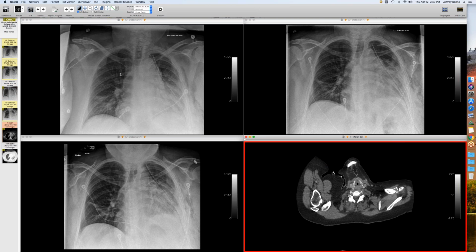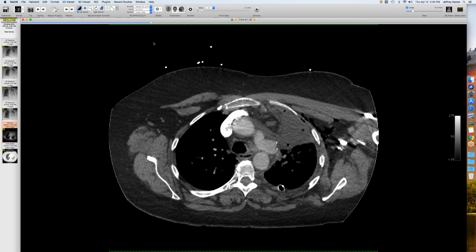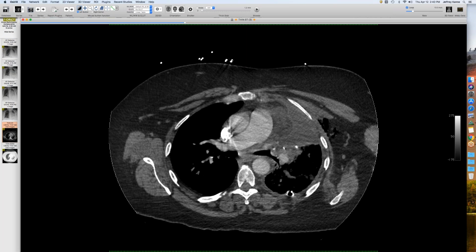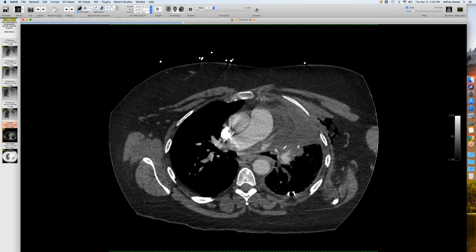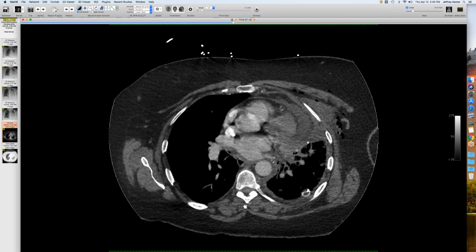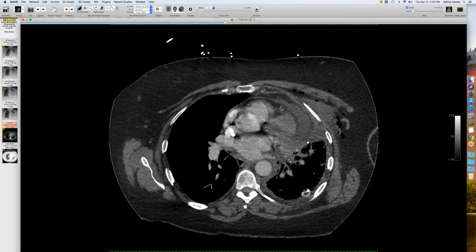So we got a CT the same day as the last radiograph, which I will share with you. And we can see here that there's this collection anteriorly. So I believe this was an upper lobectomy. So superior pulmonary vein has been resected. Upper lobe pulmonary artery is gone. Then we see the lower lobe pulmonary artery is perfusing. But you'll notice the inferior pulmonary vein on the left is occluded, and there's some staple material in the general vicinity of it and all this soft tissue here.